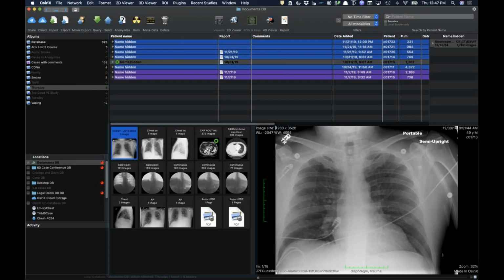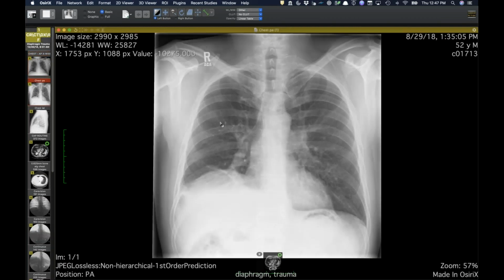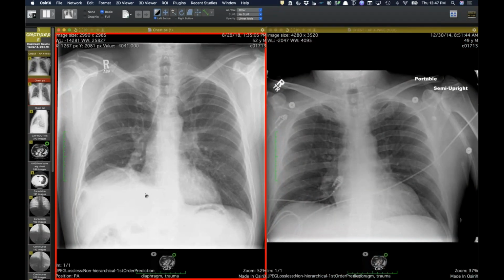Love it. Well, here's another one you're going to like, since the two of you have taught me a lot of what I know with this entity. This is a 49-year-old. Well, at the time he was 49, and this was a radiograph taken right after a go-karting accident. Nothing at the time in terms of trauma, but then he develops worsening shortness of breath and dyspnea over years. 2018, now we can see a new finding, which is this elevation of the right hemidiaphragm.